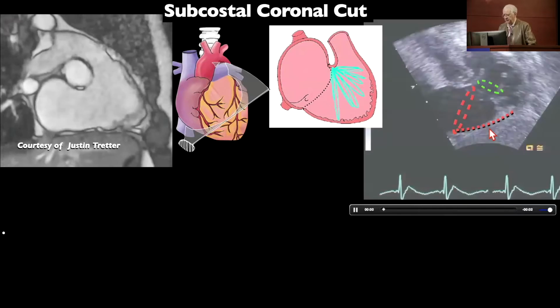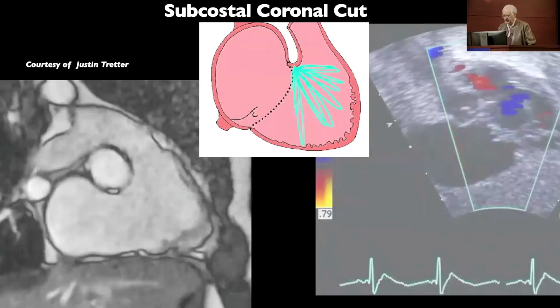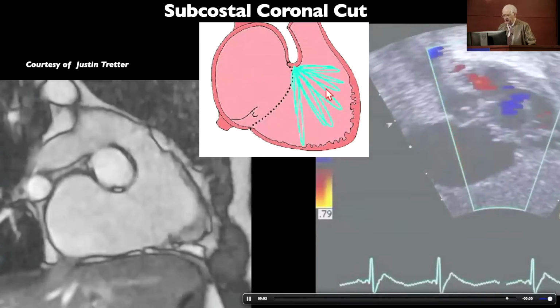In no other condition does tricuspid regurgitation present itself in a diaphragmatic position. And the diagram of Christian Shriver, which we've shown you, showing this valve.